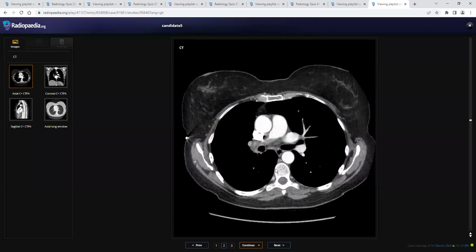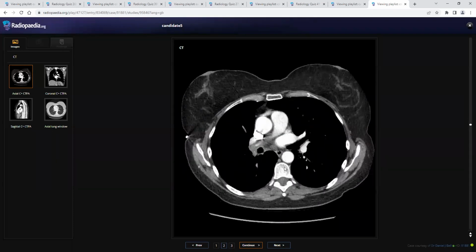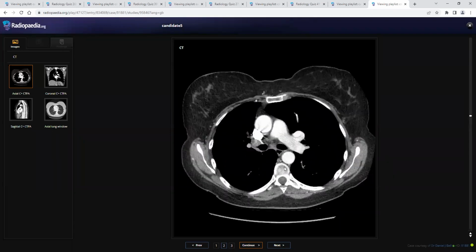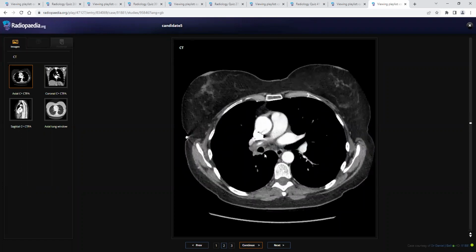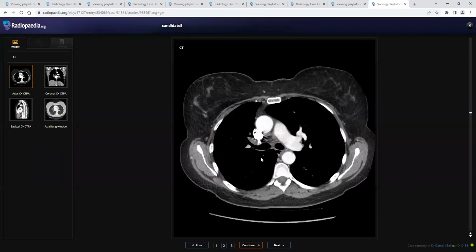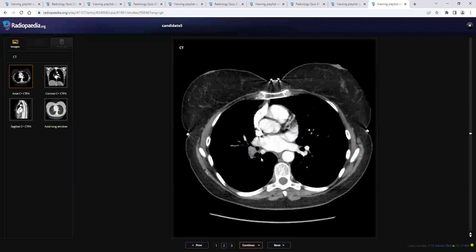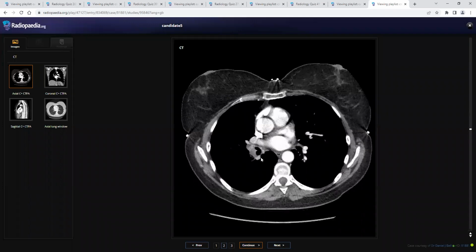The clinician is asking, is it a thrombus or not? Do I need to thrombolyse or not? It doesn't seem to be thrombus. It's very circumferential, just thickening around the vessel. So I don't think that it's a thrombosis.